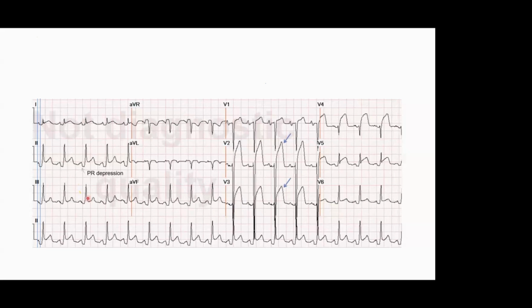Anterior MI. Yeah. Why is it not pericarditis? Because there is a diffuse ST elevation everywhere. A PR depression is there. What are the 2 points that help you tell it is anterior MI? There will be inferior wall, there is concave upward ST elevation also. Can you tell 2 points that are glaring at you to tell that it's MI with 100% surety?